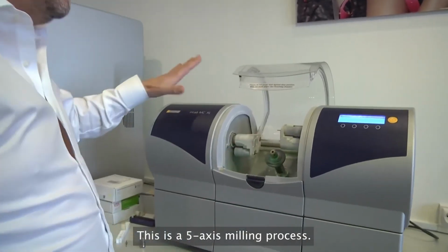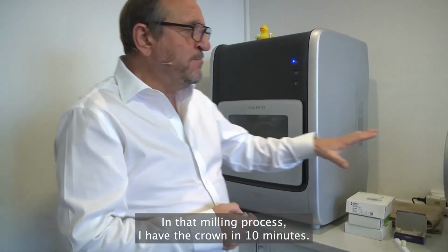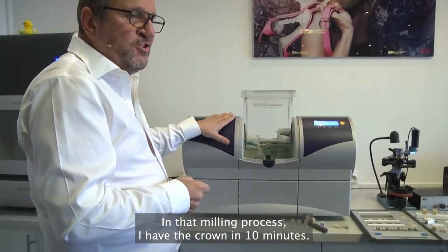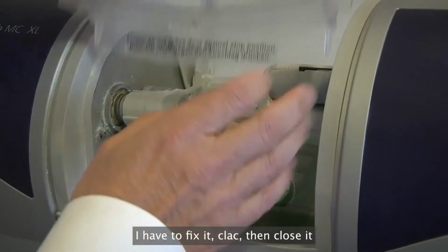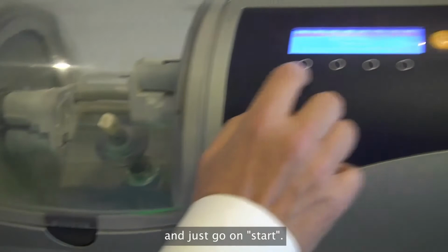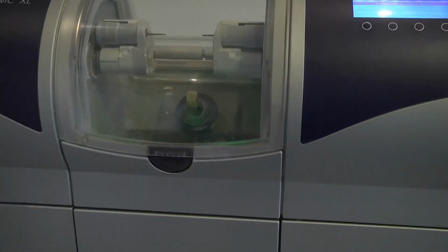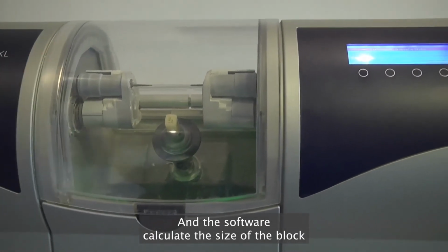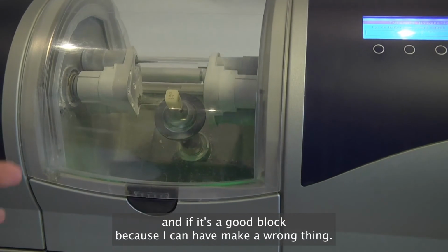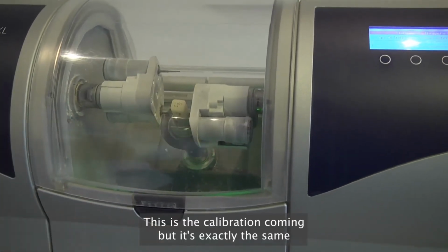This is a 5-axis milling process. In that milling process, I have the crown in 10 minutes. I have to fix it, clack, then close it, and just go on start. And the software calculates the size of the block, and whether it's a good block, because I can't have made a wrong thing. This is the calibration coming.